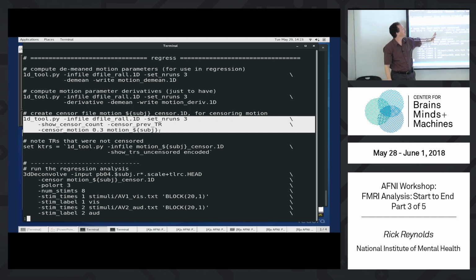So that's a per time point change in position by the subject according to our motion parameters, which are not perfect. So we have the first differences, and now we take the Euclidean norm of those 6 numbers, 3 rotations, 3 shifts. We take the square root of the sum of the squares, and that gives us a distance, say, that we use as an estimate of the change in location across time. Why square root of the sum of the squares? Well, a distance of 1 and 1 and 1, how far is that? It's the square root of 3, right? But now we're talking about 6 dimensions instead of 3. So what does this look like?